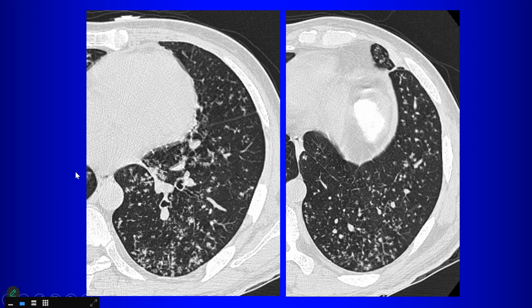We can see it, of course, with tuberculosis. Acinar nodules and tree and bud nodules are synonymous, just different modalities. Very similar, right. The acinar nodules represent the inflammation that we see, like when this kind of coalesces into a larger inflammatory mass.